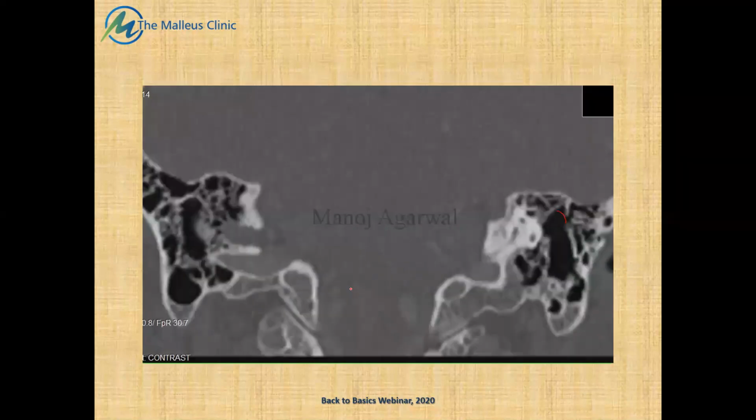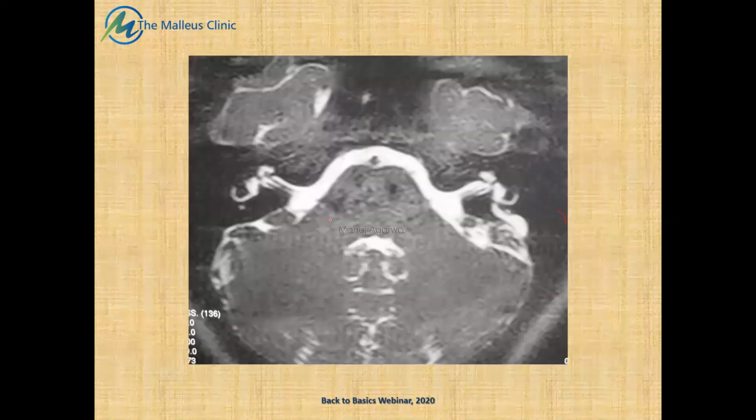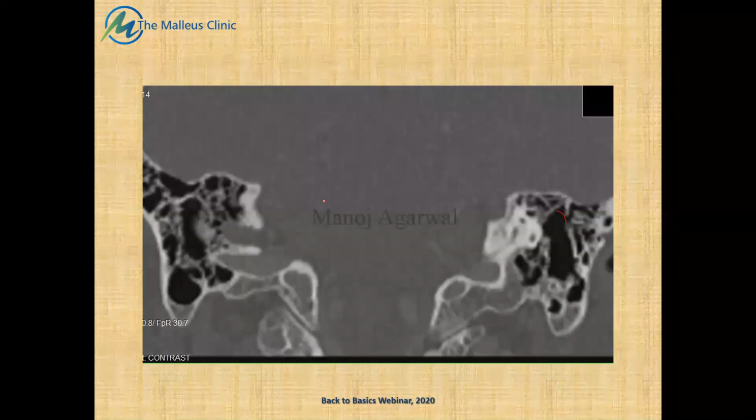Right. I'll move a little faster. We probably have just less than 10 minutes left. Vestibular aqueduct on the left side, on the right side. Okay. So this was a case of an endolymphatic sac tumor.